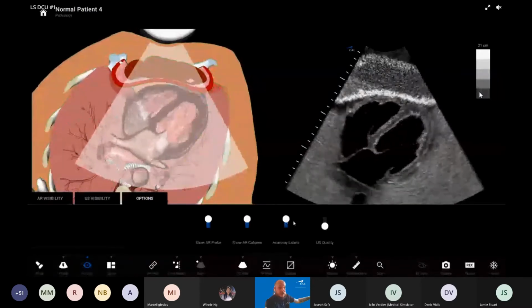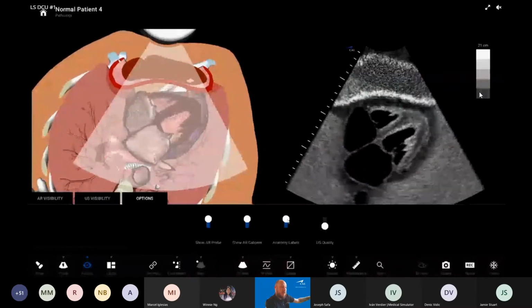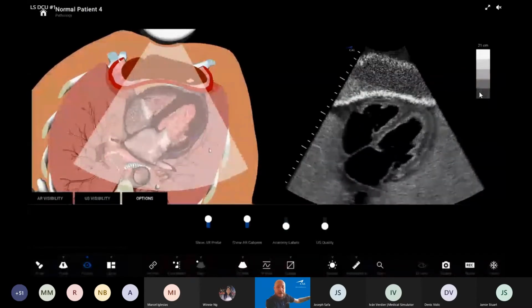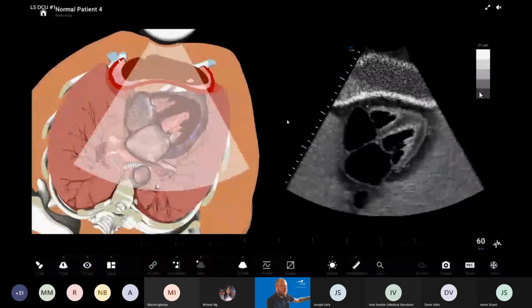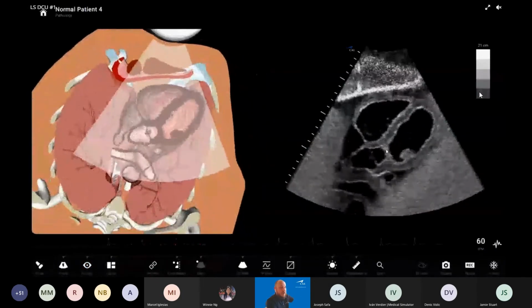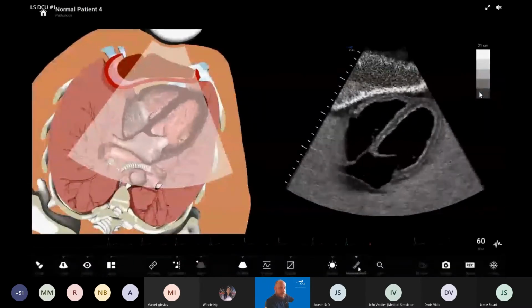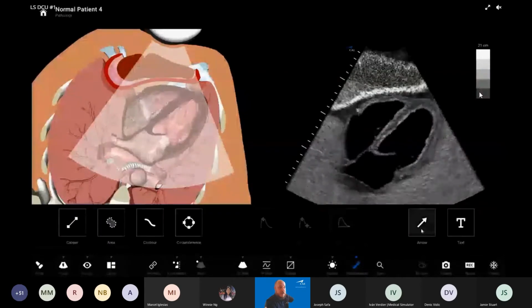This is what I usually do. When I do a demo, I usually keep this one off, because then it just highlights randomly, which doesn't really make sense. Okay, now another feature which we added for 3.2 is in the measurement menu, arrows.